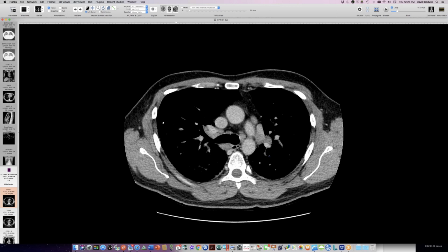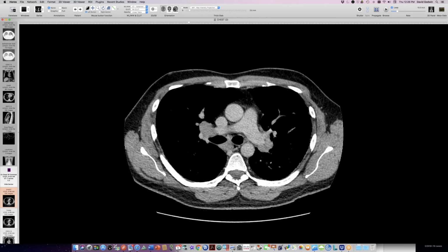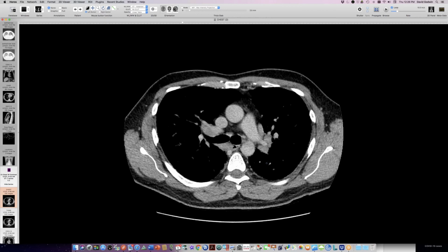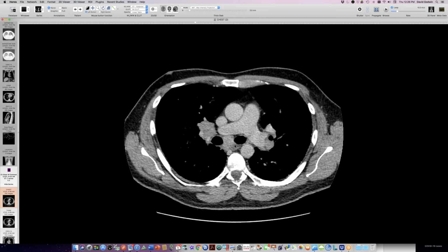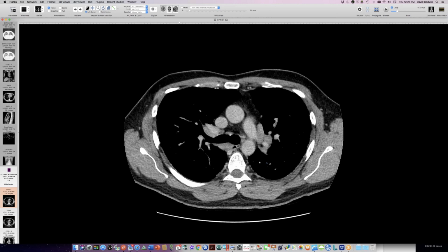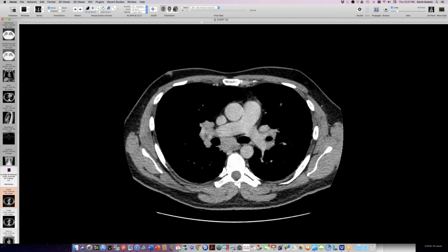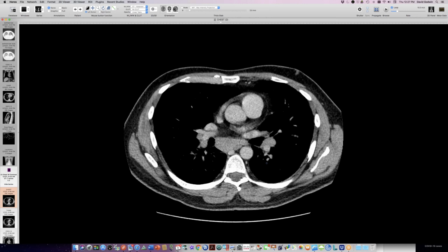So I was thinking, could this be Castleman's disease? Could it be Rosai-Dorfman? Oh, that's a good thought. I mean, they can get pronounced septal thickening, but it went away. Amyloid, sarcoid, Castleman. Again, I've seen a couple cases that looked like PVOD, but the lymphadenopathy is not right for that. That's usually more soggy, smudgy nodes. Soggy, yeah, these are well defined.